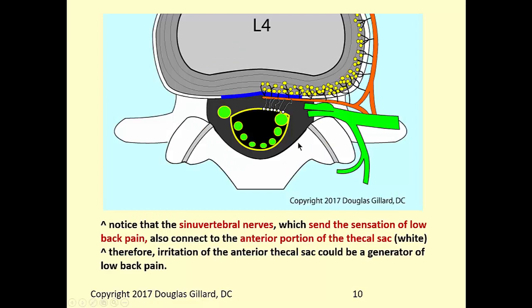I'll show you an MRI image. When we see it out here, we'll call it the exiting. We'll call both of these traversing nerve roots, even though this one's budded, because it hasn't wrapped around the pedicle yet. So this is still the traversing nerve root.